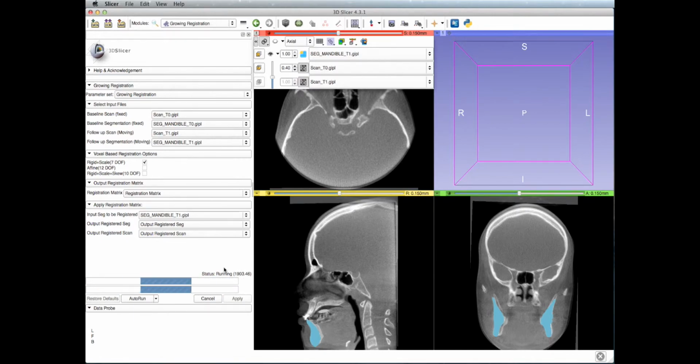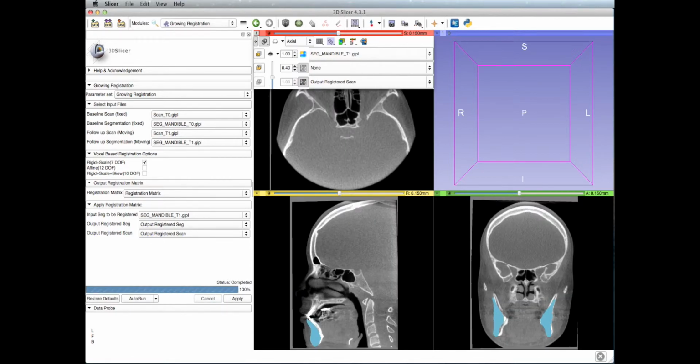You can check the results by comparing the T1 scan with the Output Registered Scan by clicking the tiny pin icon, then selecting the rings and clicking the double back caret option if it hasn't been selected yet. Then select the scans. Move the crossfade bar up and down to change the transparency.